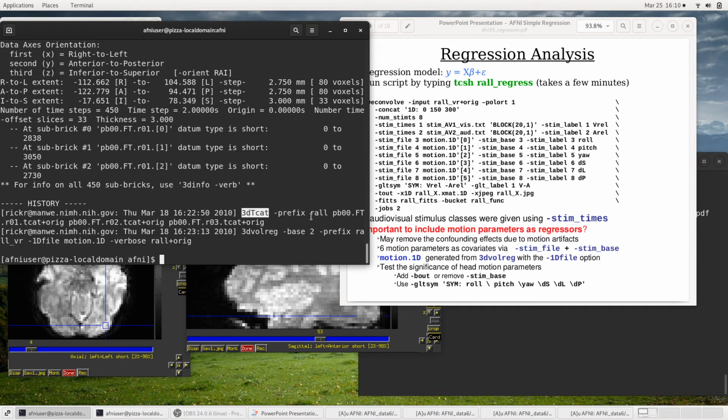3D TCAT was used to put together run 1, run 2, and run 3 from an AFNI proc output directory where this is the result of 3D TCAT. So these data sets are basically original except for removing the pre-steady state time points. So instead of 152 volumes per run, they'll have 150, as we said we want to work with, and therefore 3 runs, you'll notice, have 450 time points. TR is still 2, still 33 slices.